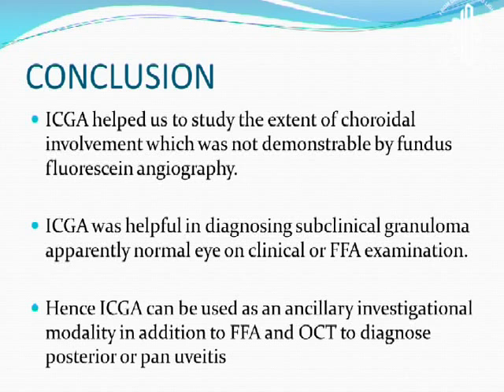changes in the retina. The conclusion of our study was that ICGA helped us to study the extent of choroidal involvement, which was not demonstrable by FFA, and it was helpful in diagnosing subclinical granulomas in apparently normal areas on clinical or FFA examination. It can also be used as an ancillary investigation in addition to FFA and OCT to diagnose posterior or panuveitis cases.